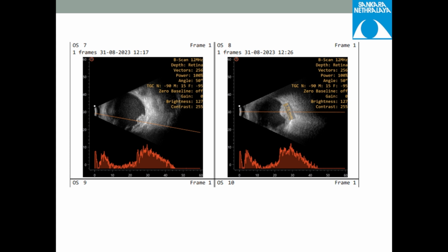Say tomorrow I want to do some kind of a plaque. So I need to know, how would I mention it? What is the standard description? What two measurements do I need? Height I know because you mentioned it. The breadth and the basal diameter. Basal diameter is basal diameter. Tell me, how do you take that? Transverse basal and the maximum height.